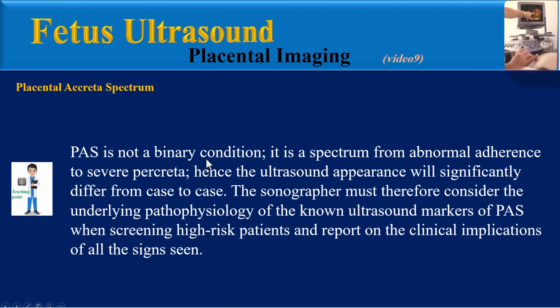PAS is not a binary condition, it's a spectrum from abnormal adherence to severe percreta. Hence, the ultrasound appearance will significantly differ from case to case. The sonographer must therefore consider the underlying pathophysiology of the known ultrasound markers of Placenta Accreta Spectrum when screening high-risk patients and report on the clinical implications of all the signs seen.